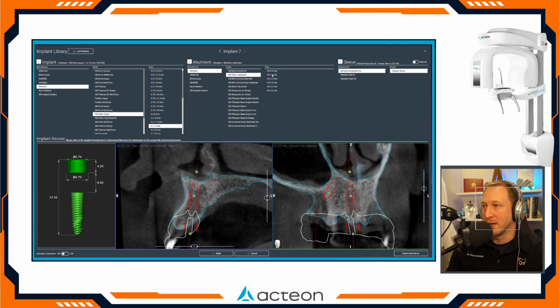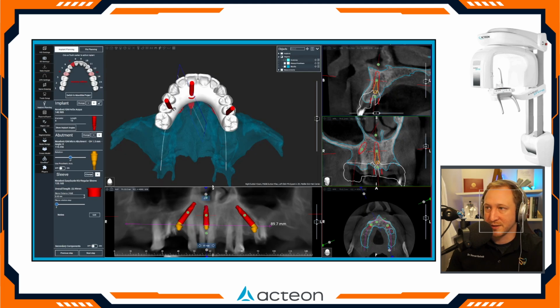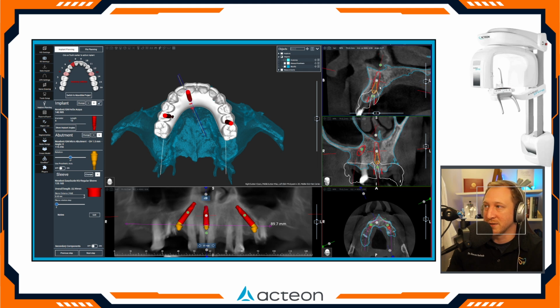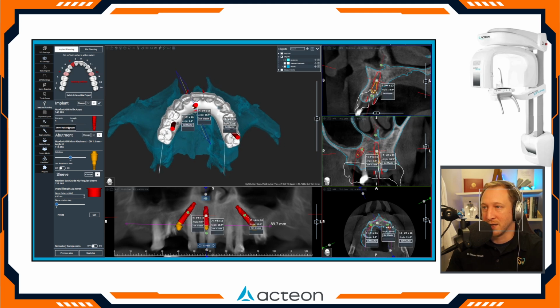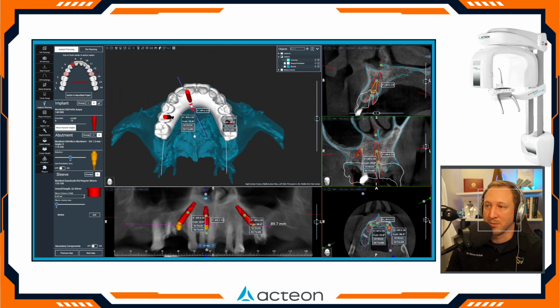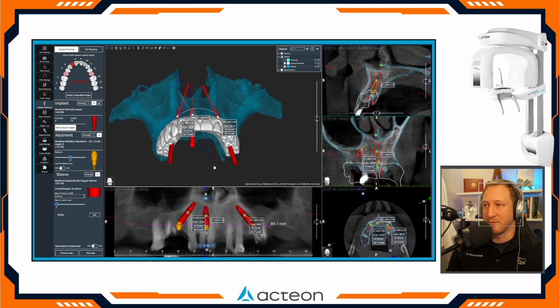We're going to switch to a straight abutment and see if we can't get that to be ideal. You can see that's exactly where I placed it. It'd be nice if I had tilted this just a little bit and gave us a little bit less of a shelf there in the front. I can hit show implant angles, and you see this angle is actually showing me the angle after the multi-unit's been on, so the prosthetic angle. So if I set my front one as the master angle, it shows me the divergence, 26 degrees in the back by number 13, 15 degrees here. That's totally reasonable prosthetically, restoratively. That's easy to restore. Okay, we want to stay below 30, ideally below 20 for those prosthetic angles.